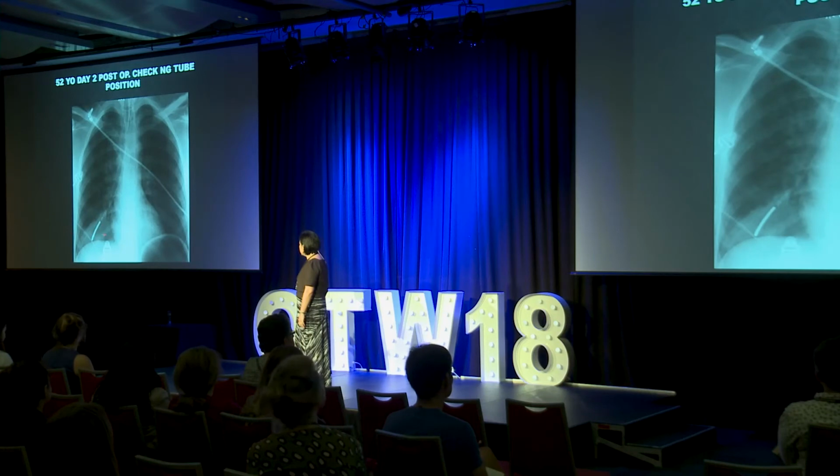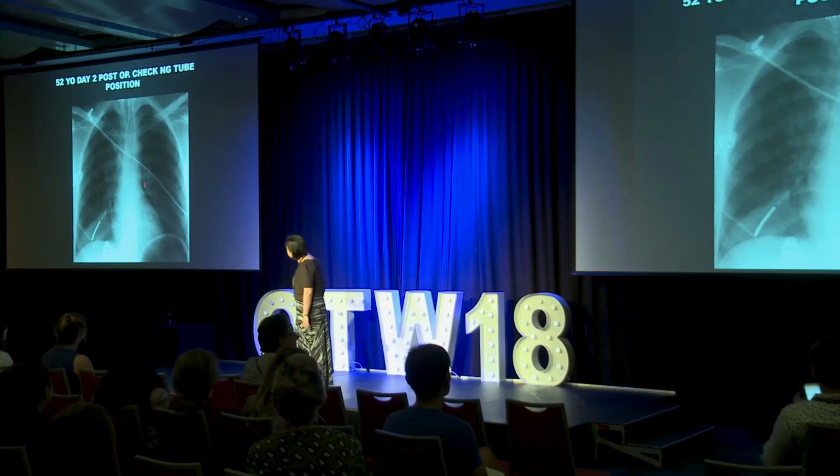So in this case, usually you'll need to retract it. You can either move it all the way back and then reinsert, or you can take it all the way out and reinsert.